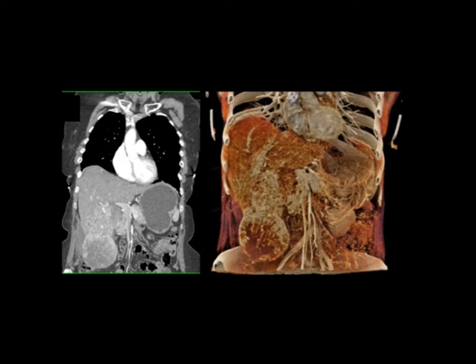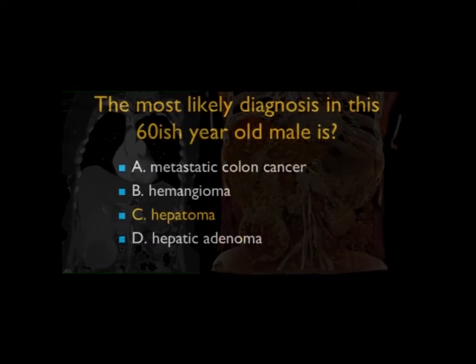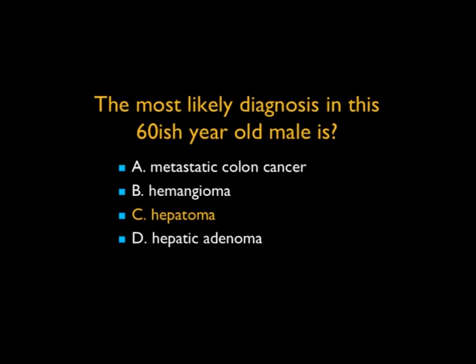This obviously by enhancement is not a hemangioma, and it's not a hepatic adenoma. This is most consistent with a hepatoma.